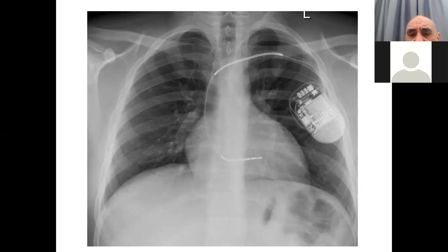If it was a pacemaker, you would only see the thin wire without any cover or coil around the lead. The tip of the pacemaker or defibrillator usually will be inserted into the right ventricle, across the tricuspid valve. So the patient received an ICD after he was successfully resuscitated from ventricular tachycardia secondary to Brugada syndrome.